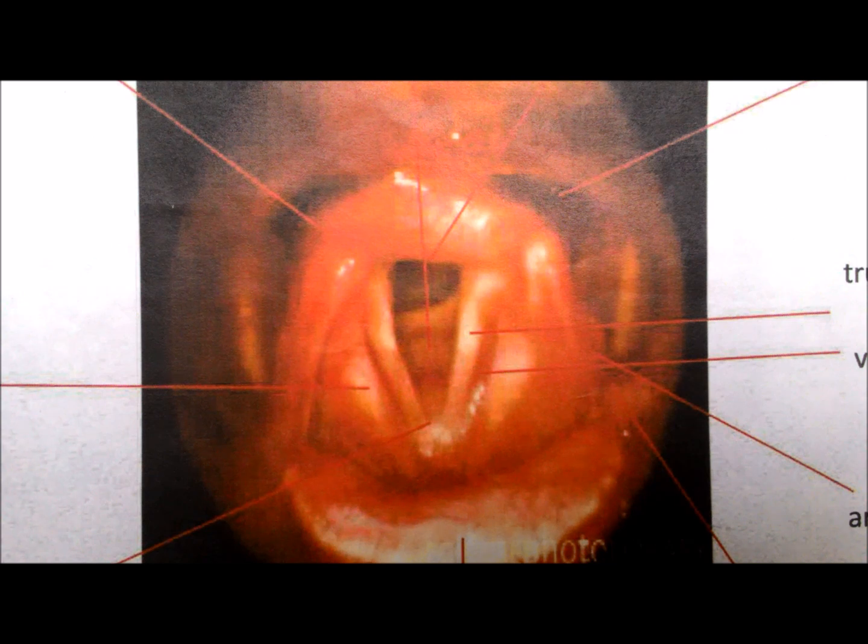It was first described by Langmore in 1988. Nowadays, it is a standard tool for diagnosing and treating dysphagia. Speech and language therapists use endoscopy for swallow evaluation to diagnose dysphagia, to assess the nature of the problem, and to guide the dietary and behavioral management.